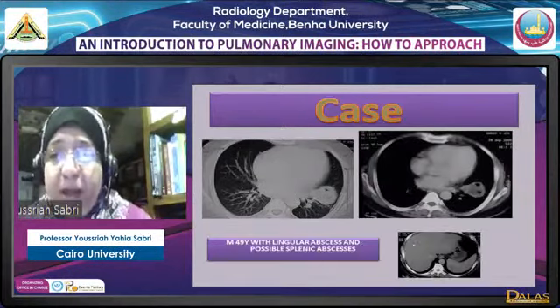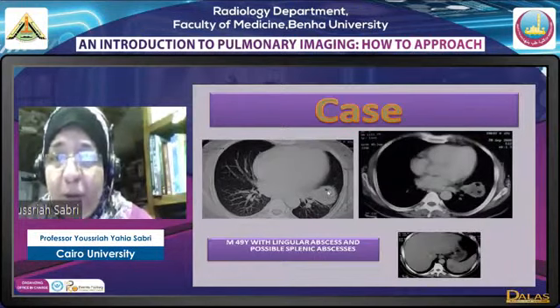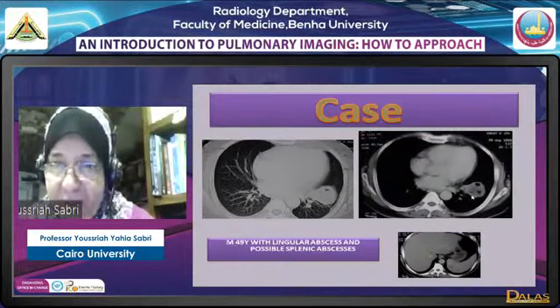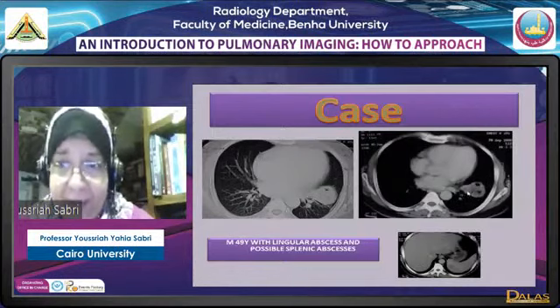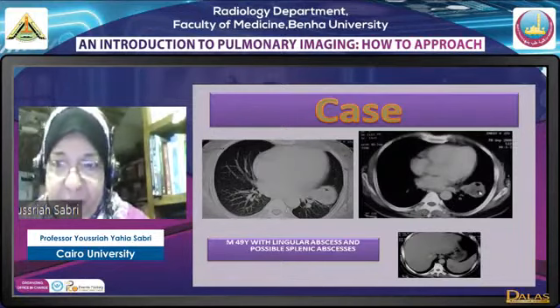When we look at the mediastinal window, we find it had fluid and air locules. So the lumen actually is central, not eccentric. The only thing that was apparent in the lung window was the locule, so it gave me an appearance of a misunderstanding that we are dealing with eccentric. However, it is totally central with a totally uniform wall. This is an abscess. So strengthen again, it's very important to see the mediastinal window for tissue characterization.